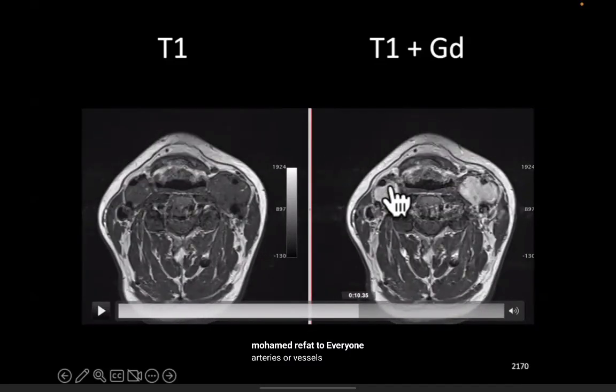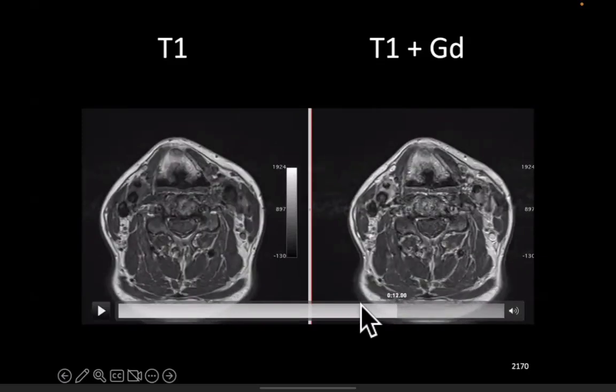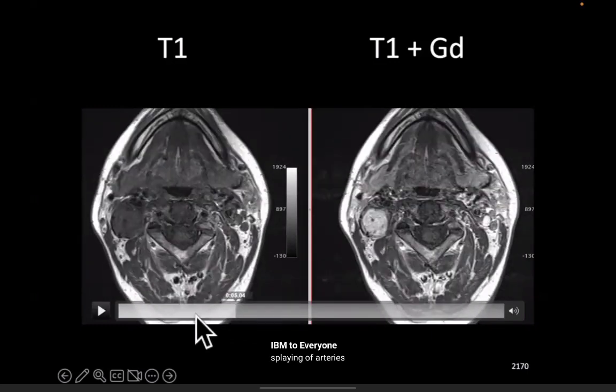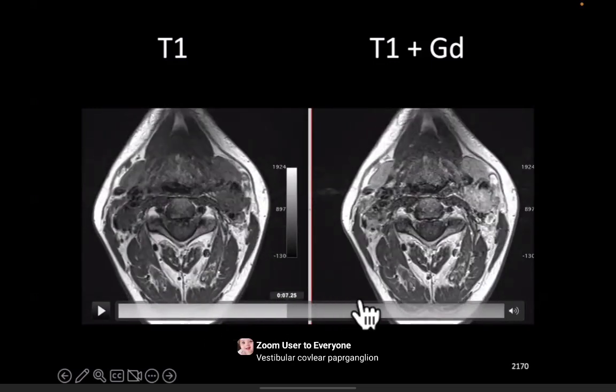And then we've got two carotid body tumours here at the bifurcation, which are obviously in the carotid sheath because of the bifurcation of the carotid artery. But the salt and pepper appearance is much more florid in the upper one as opposed to the lower ones.